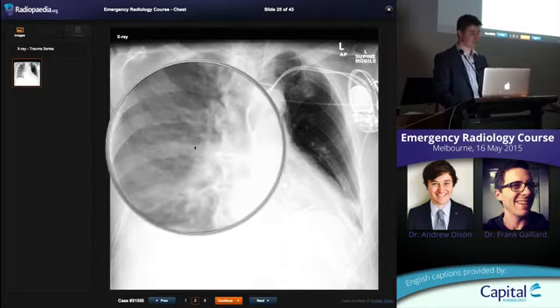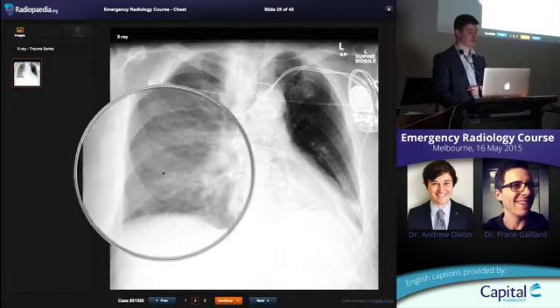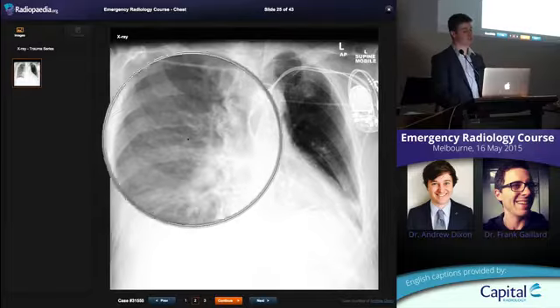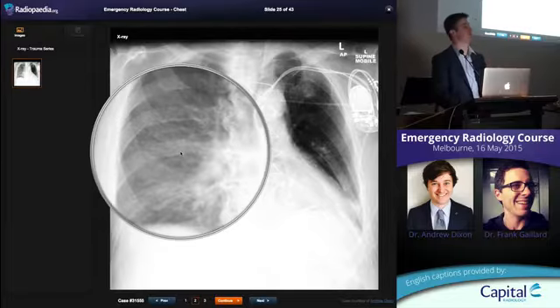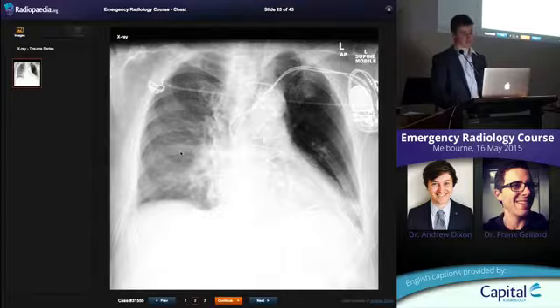Again, I want to emphasise that you can trace these vessels. We've got white branching things all through this. Even though there's generally increased density, you can see the vessels because there's air right next to the vessels. If that was consolidation, airspace opacity, you wouldn't see the vessels, you'd see black branching things. So I'm thinking this is not within the alveolar space, it's covering the whole chest.